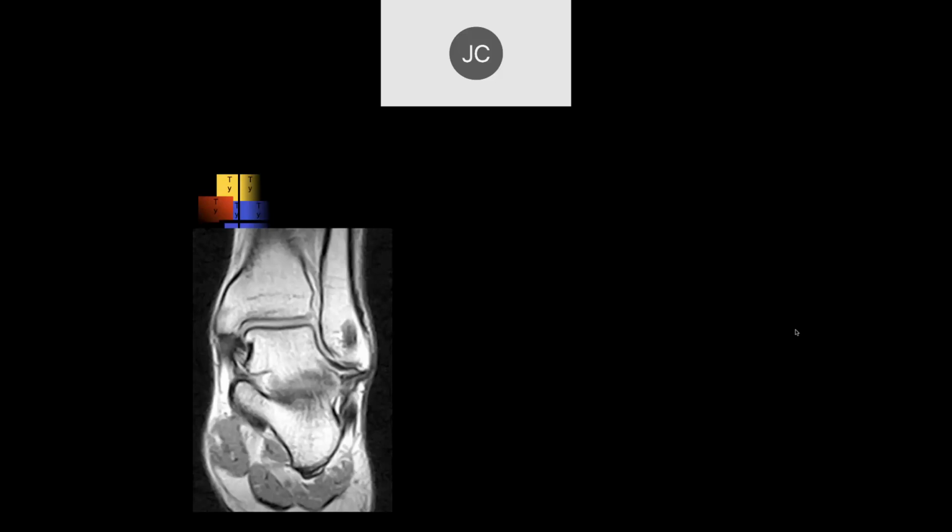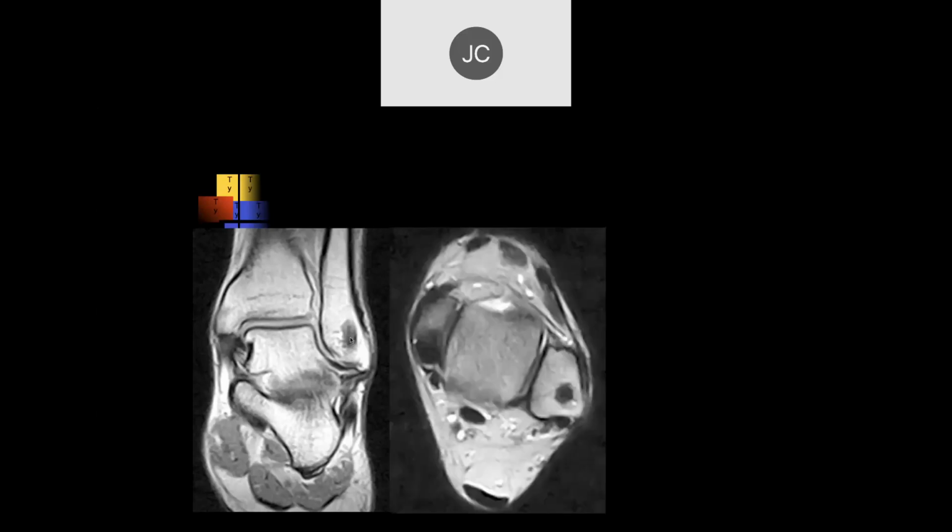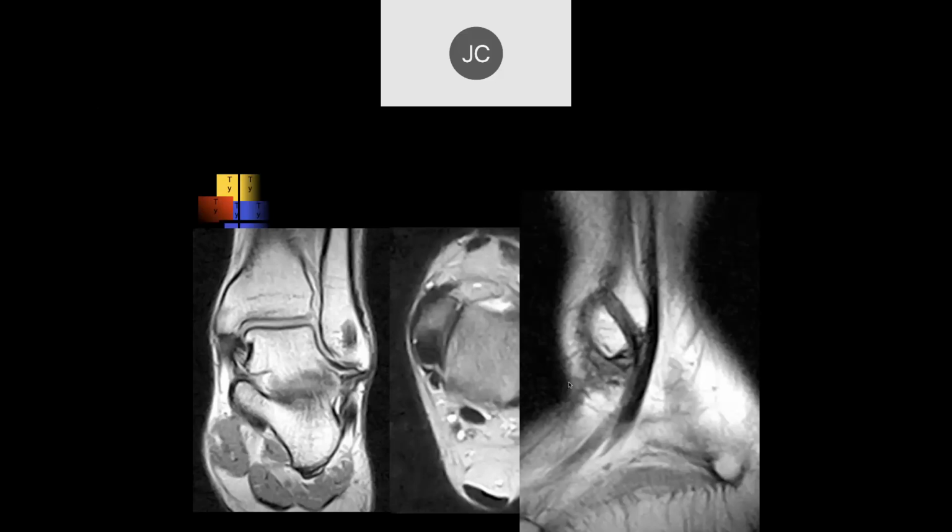I think we saw this case earlier, a couple of days ago. The tendon going through the bone. You're saying that's surgery, right? Yeah, so we see a hole in the bone there. If we do the axial images, there we see it. If we go to the sagittal, what we see is the brevis is coming here from the base of the fifth up into a tunnel within the lateral malleolus where it's fixed on the other side, and this is the longus coming down here.